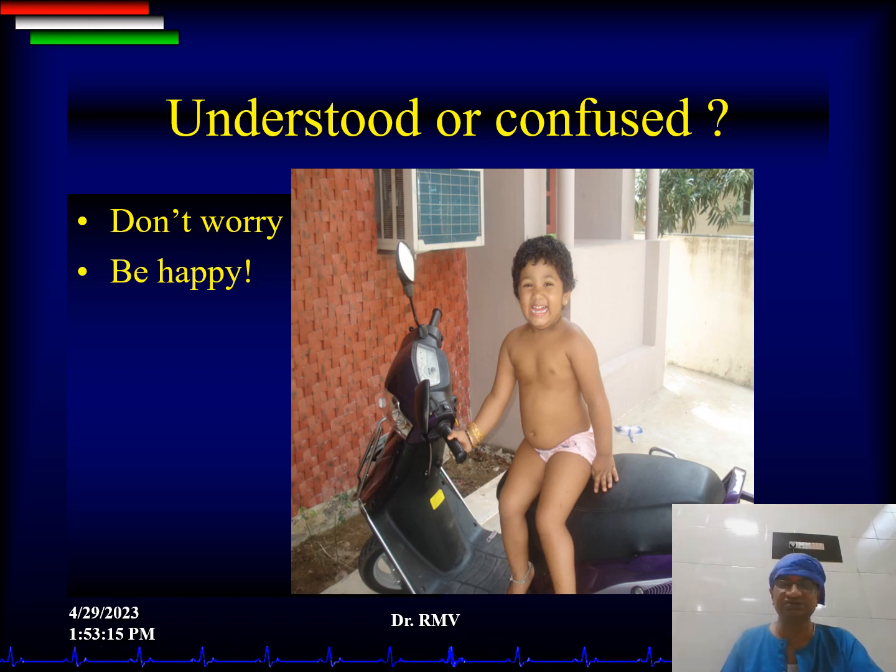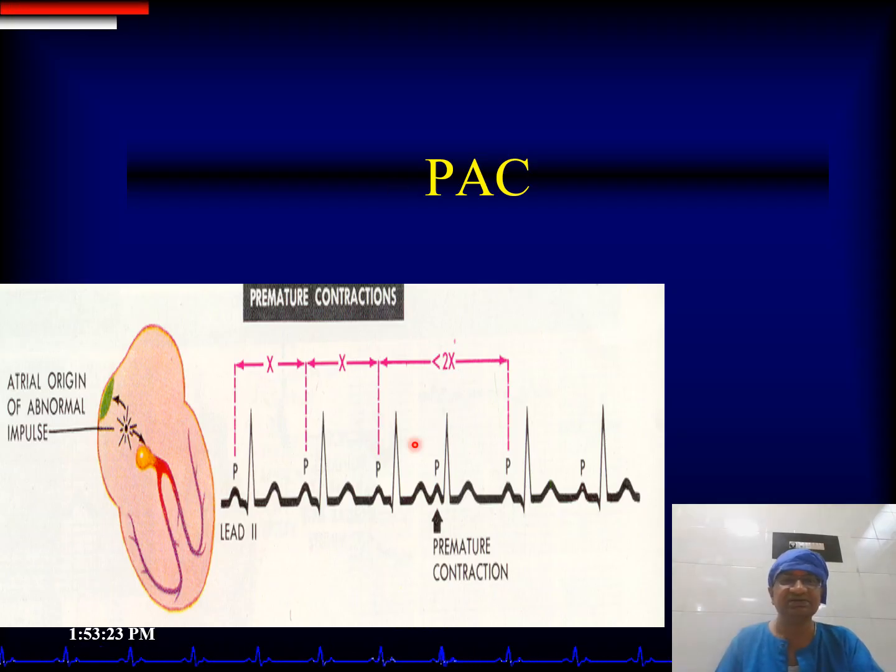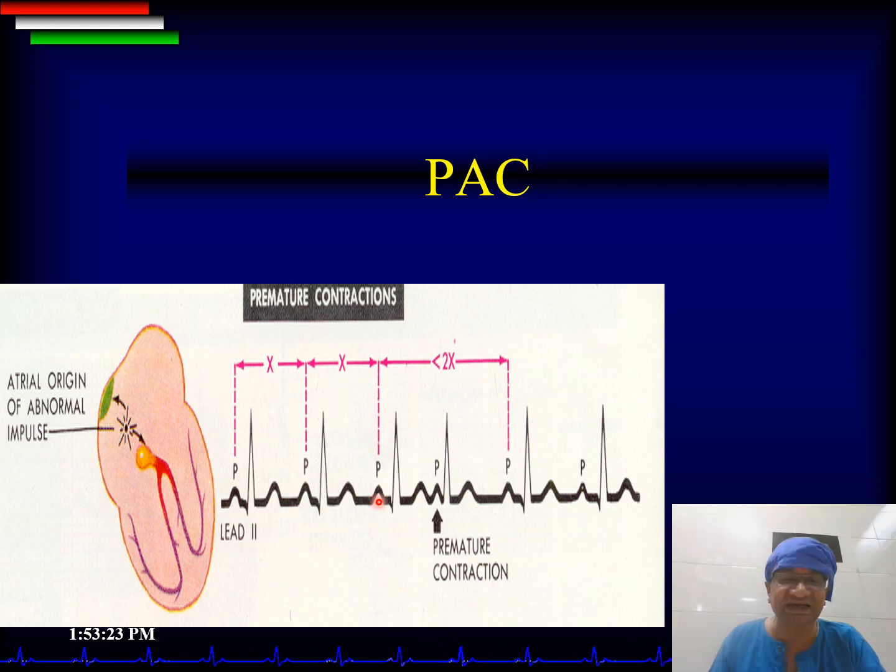So maybe you understood, but don't worry, be happy. This is sinus arrest, almost like going like this. This is a premature atrial contraction. See here, this is a premature contraction.